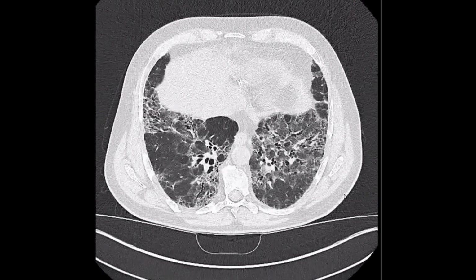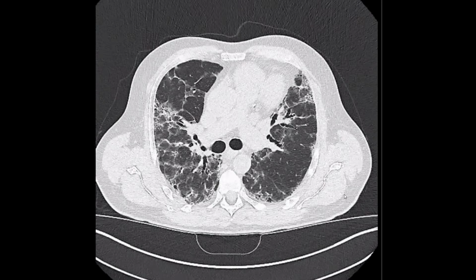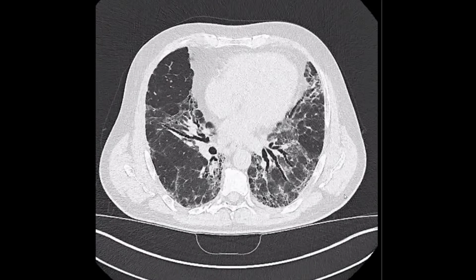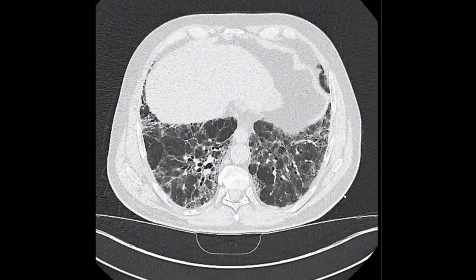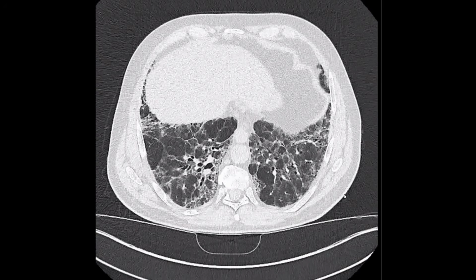Okay, fine. So this is the CT scan thorax, axial cuts, pulmonary window, in which I can appreciate architectural distortion in the form of multiple reticulations, subpleural reticulations, and bronchiectatic changes with traction and fibrotic bands as well. Lung volumes are reduced in size, and there is multi-level air trapping noted, predominantly in the mid and lower lobes.